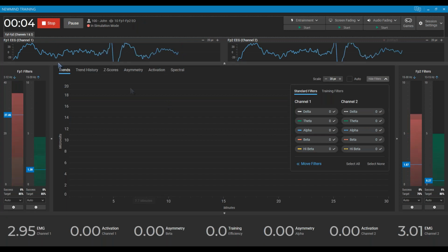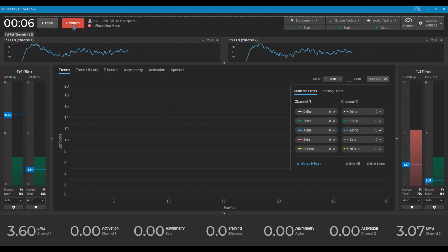Any other questions on artifact interference? All right, we got some questions that came in from Andrea regarding session playback. So let's bring a training protocol up. Let's use this one.